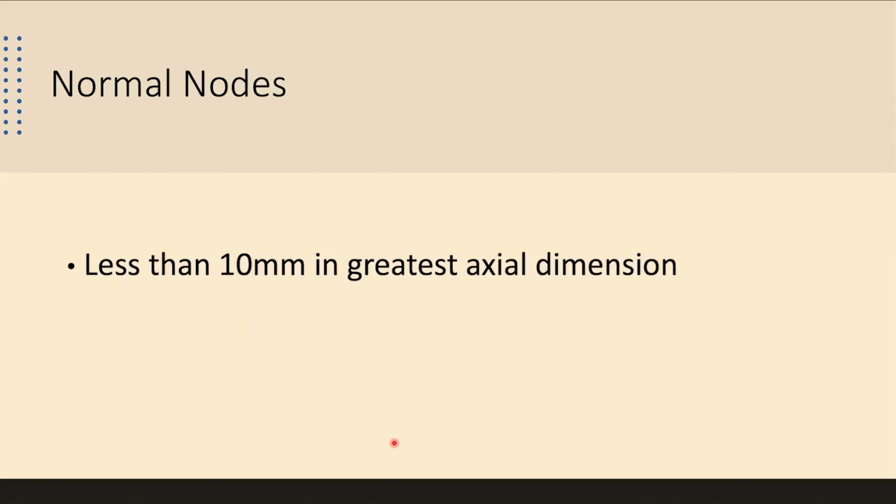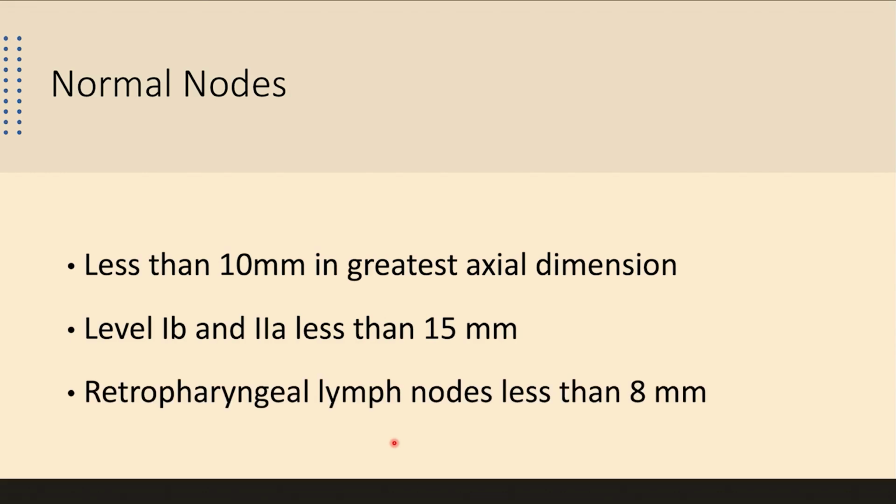So normal lymph nodes, there's always this talk about long axis, short axis. What plane do I measure in? Now, all those measurements were made without coronal reformats. Now you can see them on the coronal. I'm just going to say, measure to your heart's content, and there are measurements available out there.